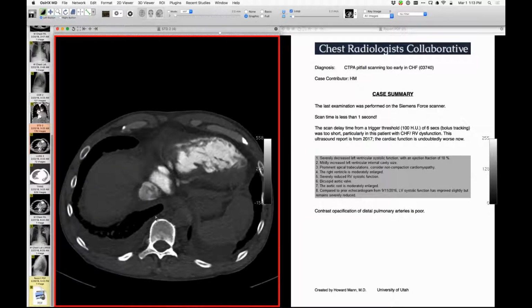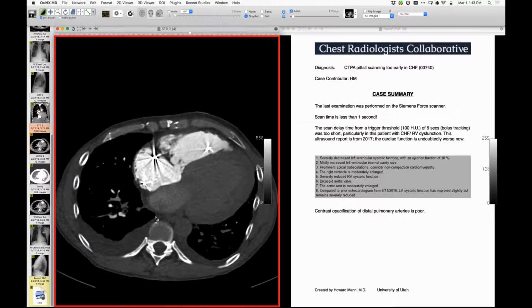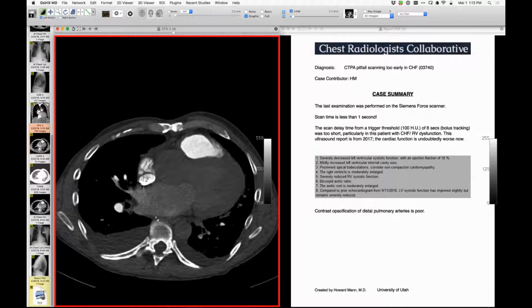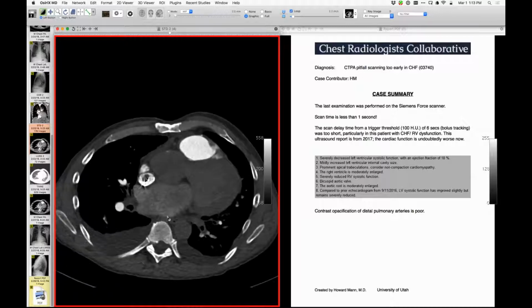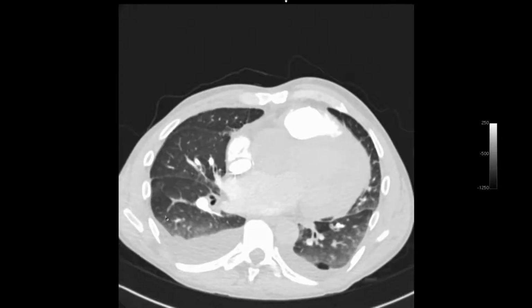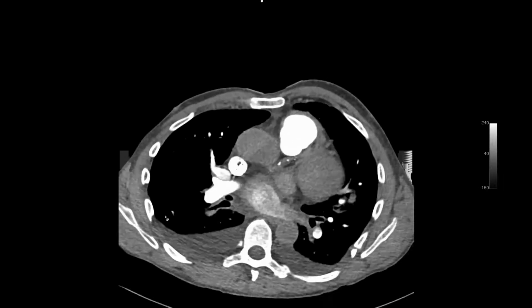So we've seen some really fast scans. I really like these scans. You know, when you do get a scan like this, the vessels are very crisp. And the problem of pulsation artifact, for example, even in this patient, if you look at the vessels, thrombus in the SVC there next to that catheter too. See if that is the case.